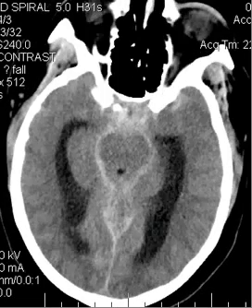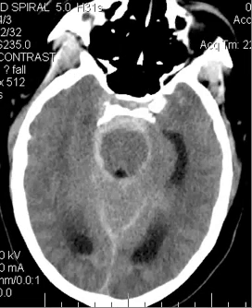Alright, look in the ventricles. This is a very important observation to make. You see the little levels there? You see the little hyperdense material? The ventricle actually goes back here. So this little bit of hyperdense material here and here is blood layering out in the dependent aspect of the lateral ventricles. This is a very good shot showing the amount of blood in the prepontine cistern.